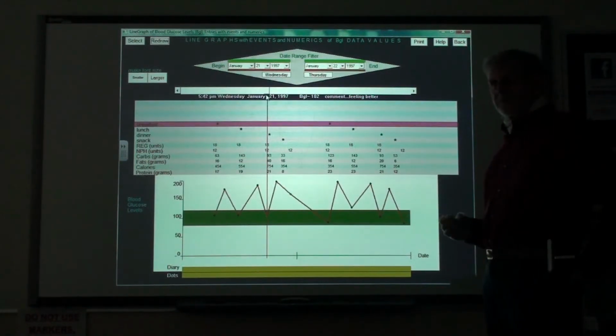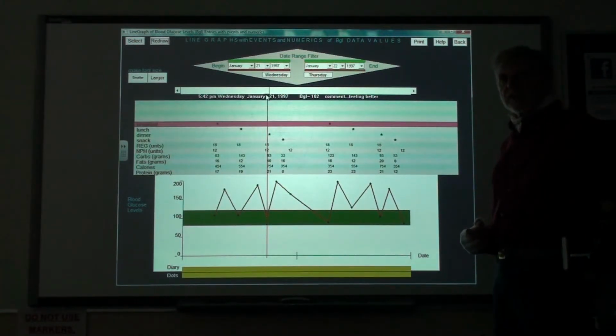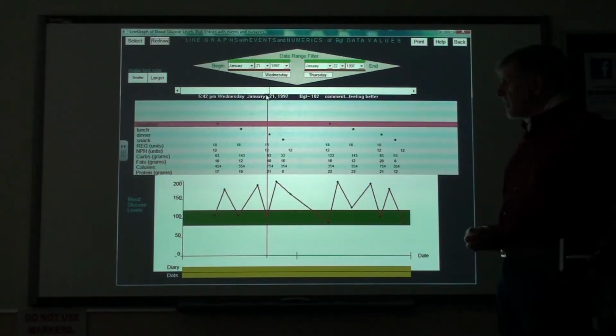After the adjustments have been made and your readings are staying within your target zone, then you do not need to analyze at this level of detail until they once again, at some later time, call for this level of analysis. So this is used when needed.